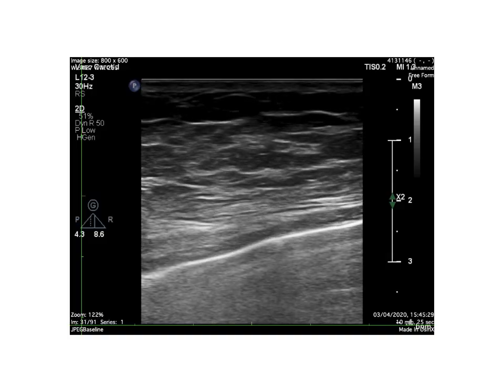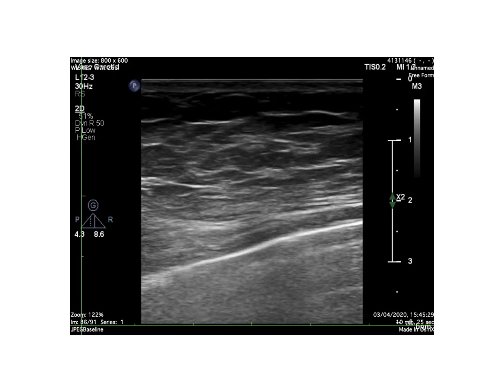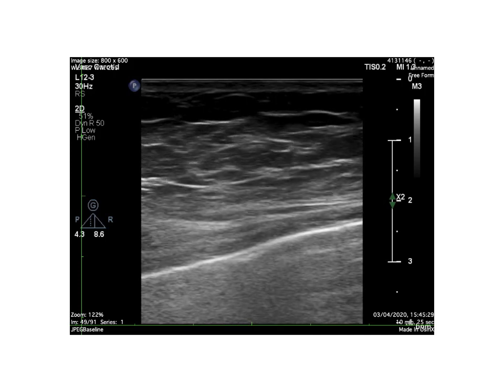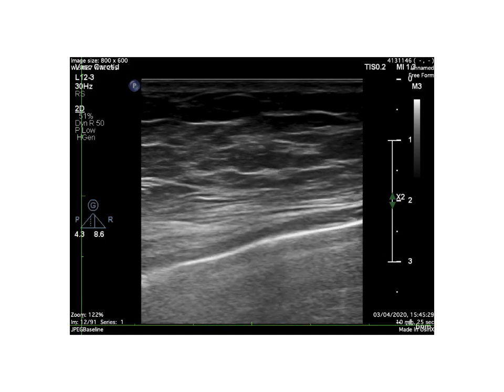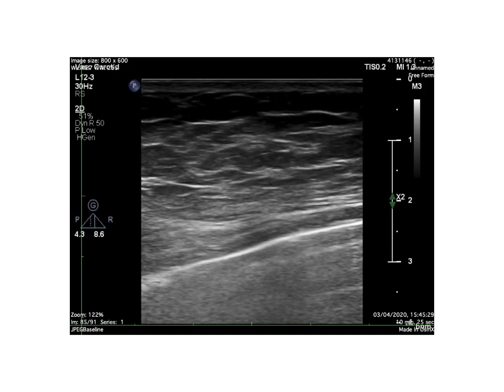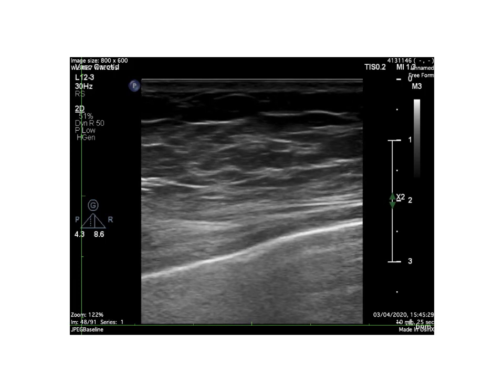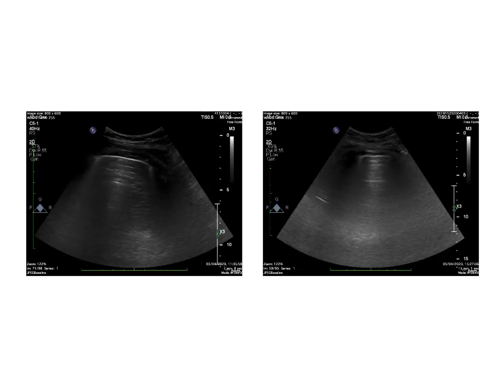And this is the same patient that we just saw together about 2 weeks later with the recovery of the pleura. He's quite lucky because his pleura is recovering. We are seeing patients who have residual pleural and lung pathologies, although they have survived the critical illness of COVID.